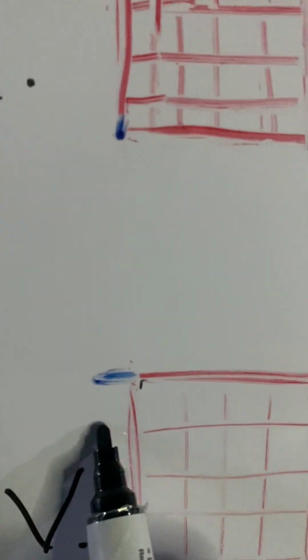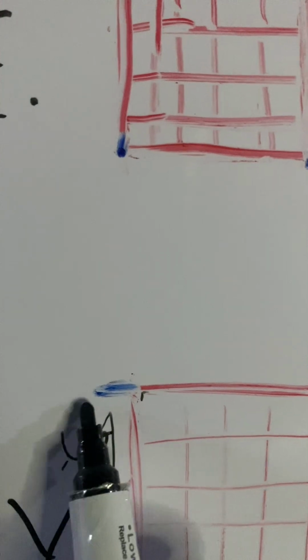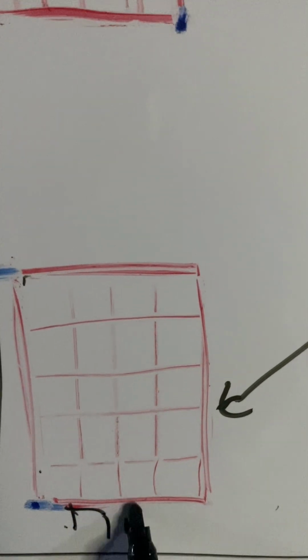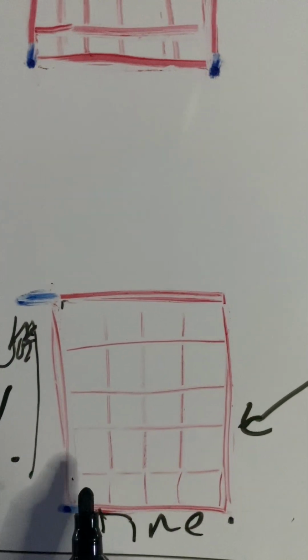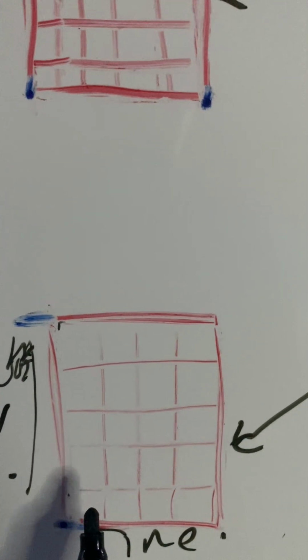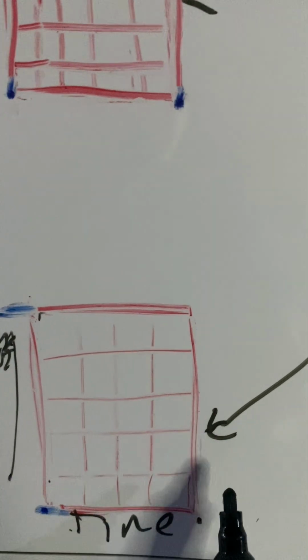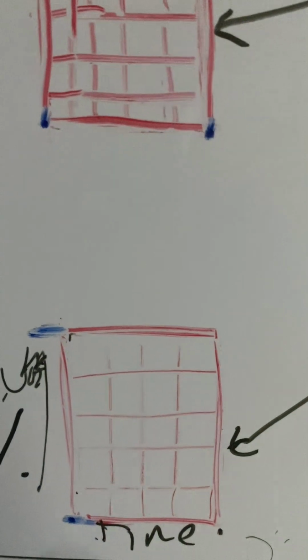Remember we said this side is our voltage or our amplitude, and this side is our time. All right, so the time is where we said this small box from here to here is 0.04 seconds, but 5 of that will lead us to what? 0.2. Now let me ask you guys a question here.